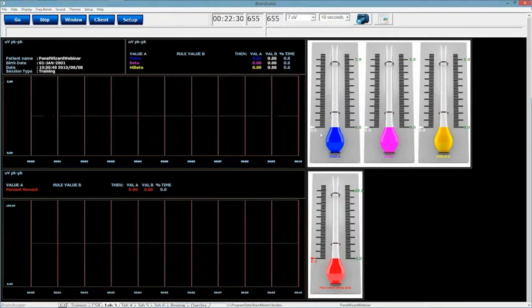And so now basically what I'd be looking at on this one is, of course, up here all my information of theta, beta, high beta, and down here my percent reward. And I was just able to do that using both the panel design of moving it around, and of course, after a little bit knowing kind of what graphs and what areas I'm working with, and using the XY coordinates and all that.